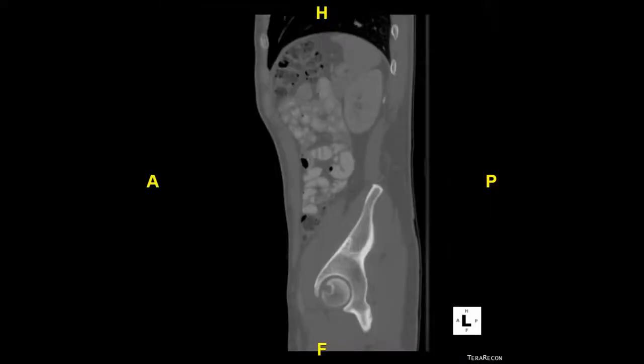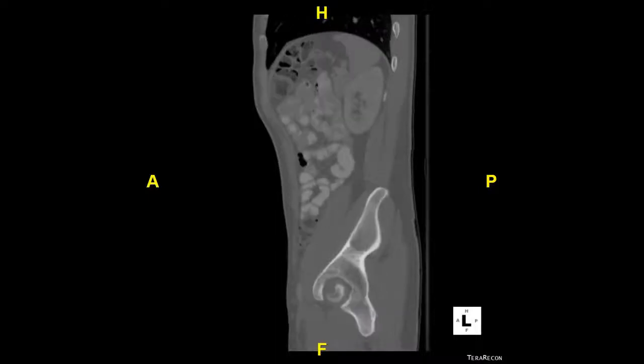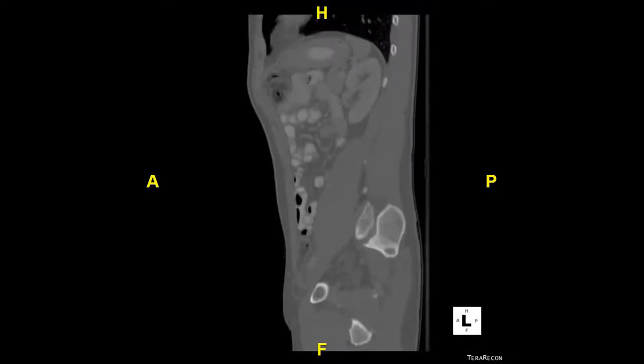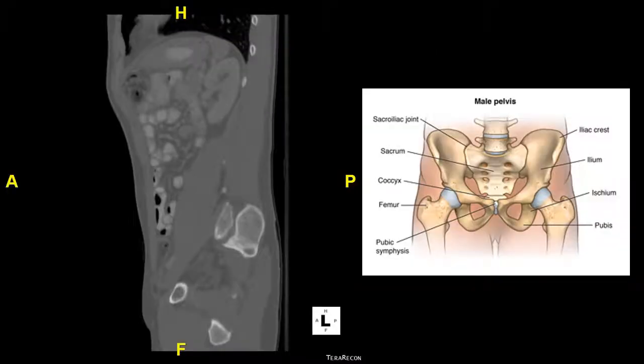The ischium is starting to come into view here. I'll circle that quickly in yellow. We have moved past the hip joint in this image. Let's quickly orient ourselves again. So I'll draw a line in black on that cartoon showing where we are. Just like that.